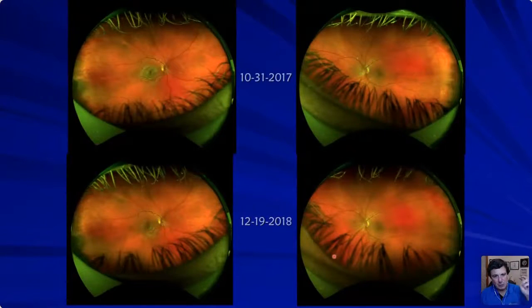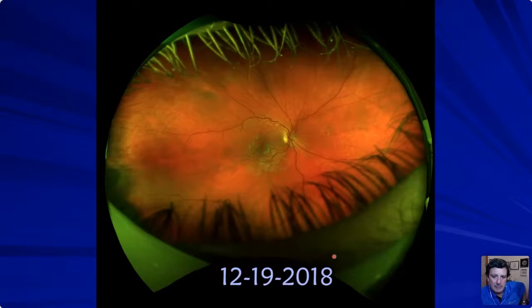But if you're getting those retinal macro changes, that's kind of like, to me, a notch on an optic nerve head or neuroretinal rim. There was GCC and nerve fiber layer loss way before that. And so now we're able to take a better look at these patients using B-scan OCT and OCT angiography. And again, here's just a bigger picture for you.